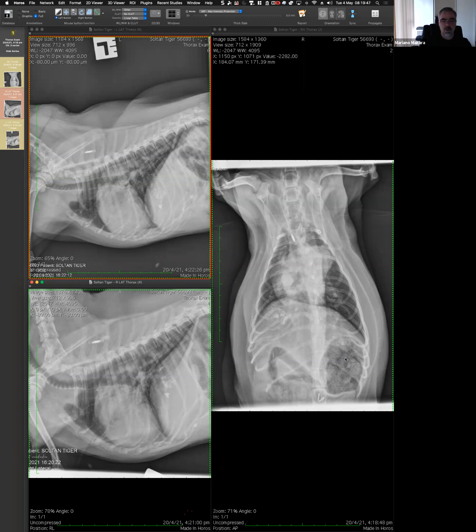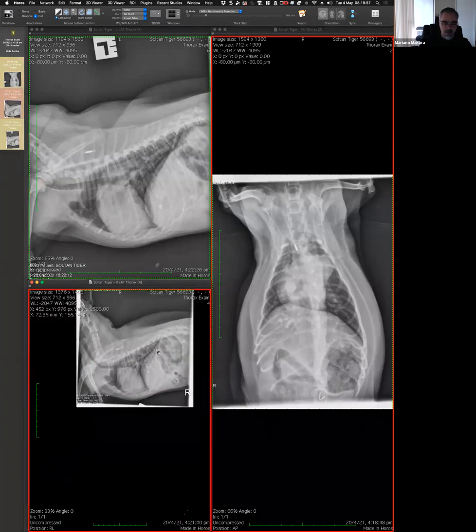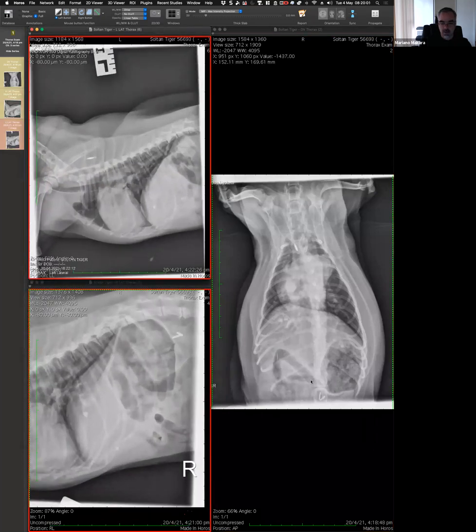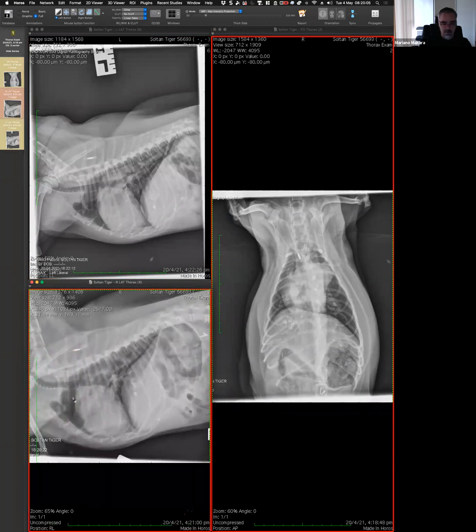So now we need to kind of untangle everything. I probably would add that there are hemoclips here, which are in the periphery of the radiograph. Oh, I didn't show you there, but they're here. I don't know what they are, but at least they're telling me that there was an abdominal surgery of some kind. Okay.